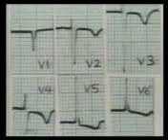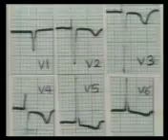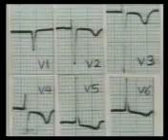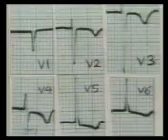This ECG shows a normal QRS pattern in the chest leads. Note the S wave in right-sided chest leads, which disappears as we reach V5 or V6. R and S are equal in V4, and the R wave progressively increases from V1 to V6.